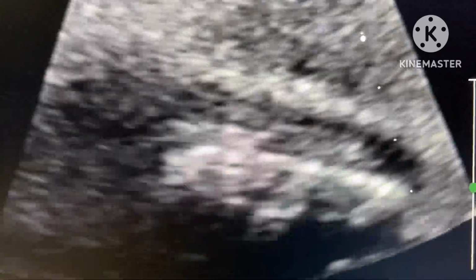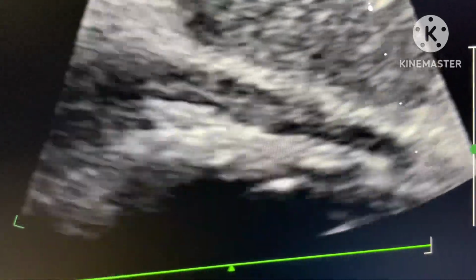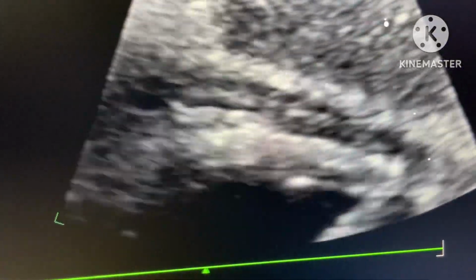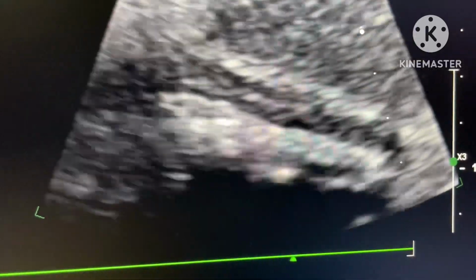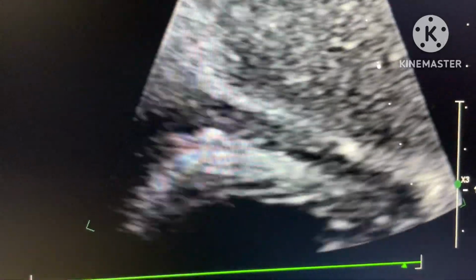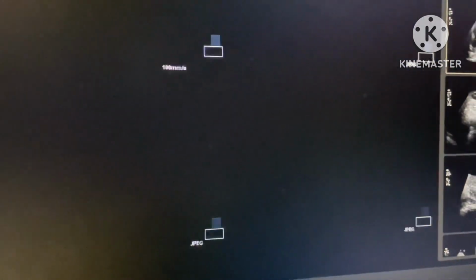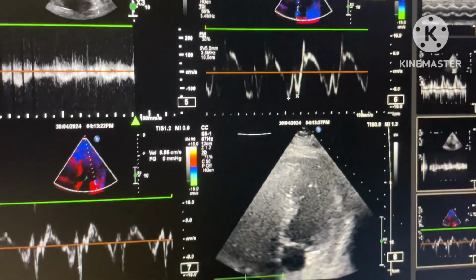So whenever you see both pericardia thickened, parietal and visceral, with minimal fluid between these two structures, and then you find paradoxical motion of the IVS, and dilated IVC with reduced respiratory variation, at the same time, annulus paradoxus motion. Now I want to show annulus paradoxus. You see this in this image.